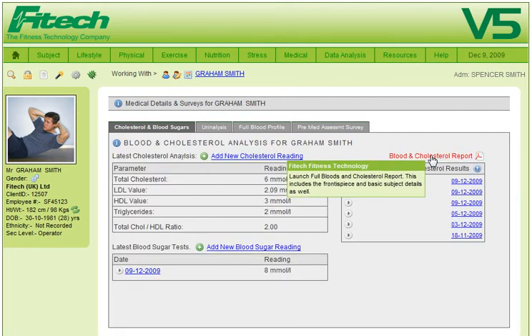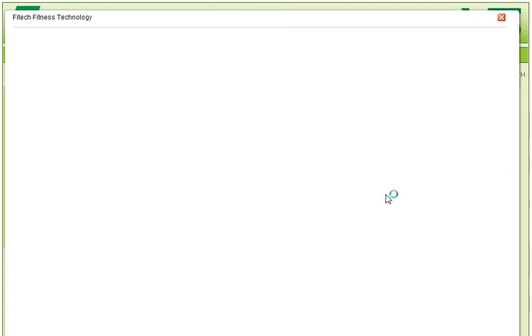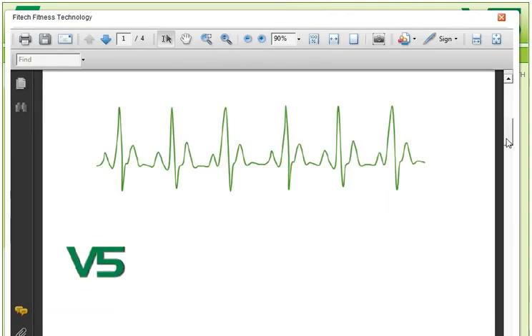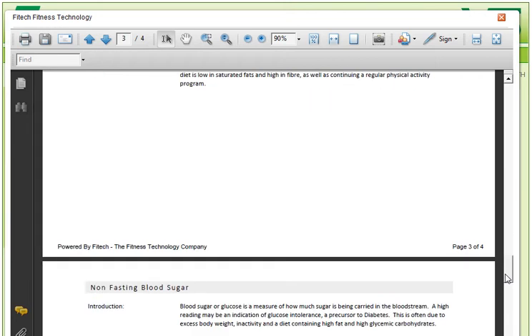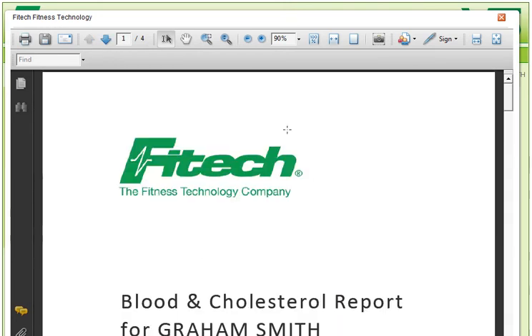There is a standalone report which will just run, so I'll click on that, and that should render the report fairly quickly, which it does, and it renders it to PDF. And as always with PDF, it will open up in the Adobe interface. If it's Internet Explorer, it will open up embedded within the inline window here.